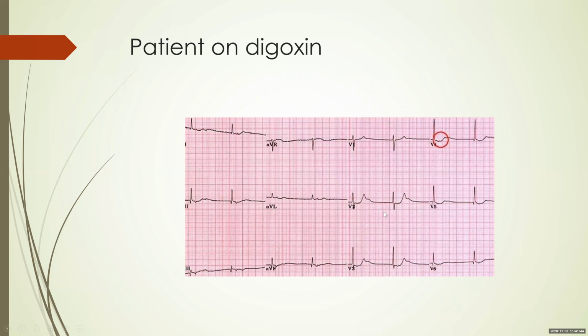Patient on digoxin, you can see the sagging ST depression with the T inversions in the anterior leads. This again has nothing to do with CAD, it's purely due to digoxin effect.